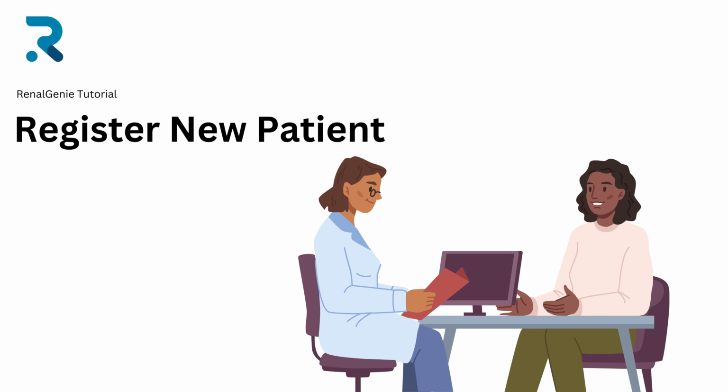In this tutorial, let's learn how to register a new patient on RenalGenie.